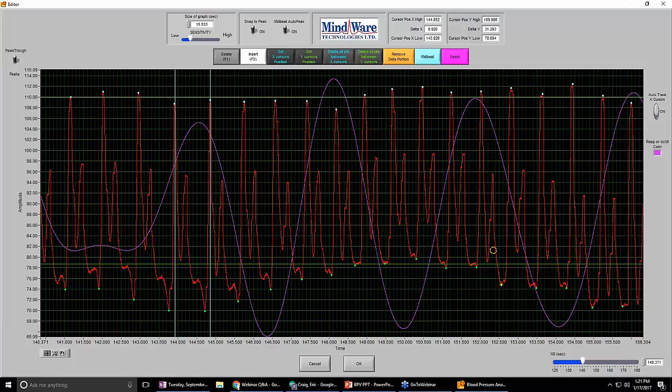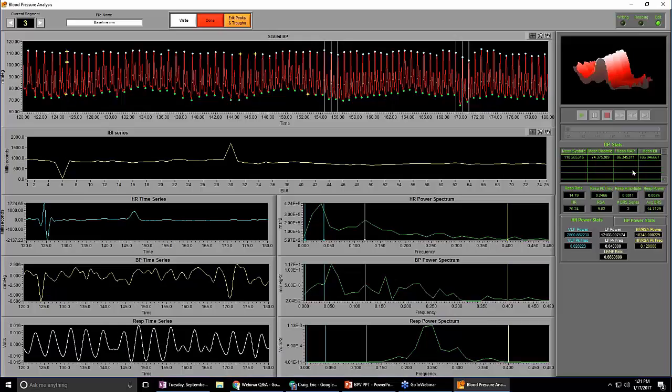But yeah, unfortunately you just have to have your cleaners write down when they're having to guess and estimate where those peaks and troughs are, and then just divide it. So let's say here, if we were to delete this peak, so that's 1, and we do know basically how many series we have here, and so then we could just divide by the total amount there, and then we'll get our percentage off. So we basically just want to keep within that 10% rule if possible.